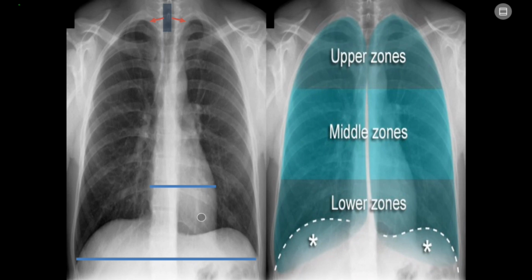And you will make sure that the projection is taken PA, or posterior anterior, because in the anterior posterior or AP projection, the heart is farther from the cassette, so the heart will appear more magnified. Some doctors believe that the patient has cardiomegaly, but the patient does not.